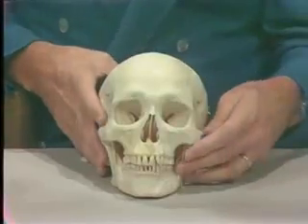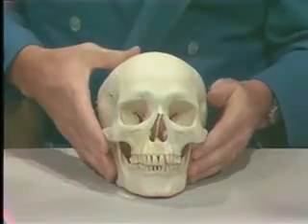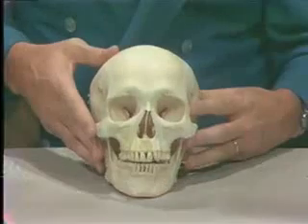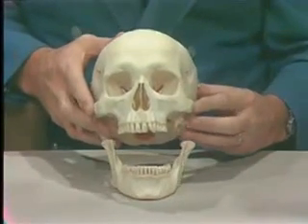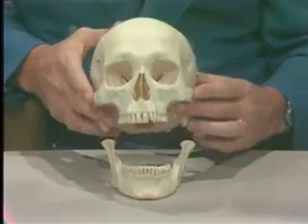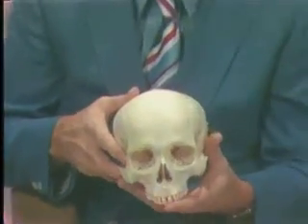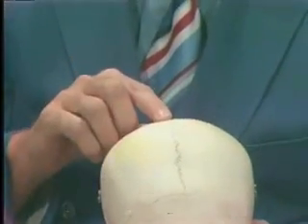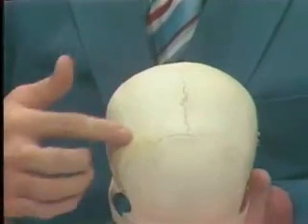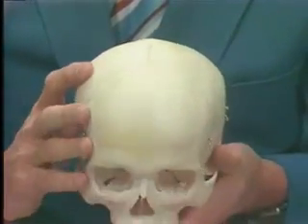The purpose of today's talk is to discuss with you the various movements of the mandible and the planes in which they move, then relate this to the articulator and the analysis of the movements on the articulator. It was demonstrated to you the movements of the jaw, and we'd like to relate those to the various planes in which they move. This is a mid-sagittal suture and the coronal suture of the skull. And the mandible moves in relation to these planes.